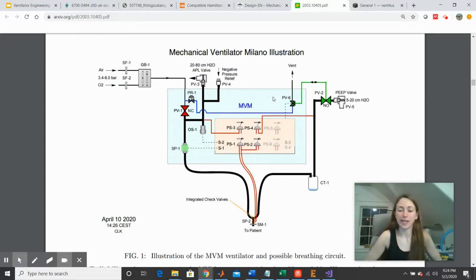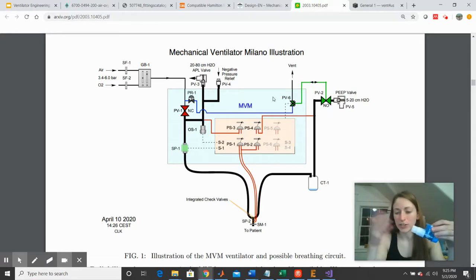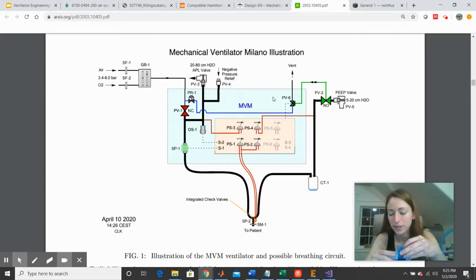But let's take this cap off. If I can get it off. May not be able to get it off. There we go. Taking this cap off for a second. So without worrying about the airflow from the pressure regulator, this is the device that we have. So there's the air in from the expiratory end. And then there's this little tiny blue diaphragm at the top. And when your pressure exceeds the PEEP value of 5 cmH2O, this little diaphragm is able to lift off and release additional air to ambient, right? So that's how you get your pressure relief to the PEEP value that you desire.